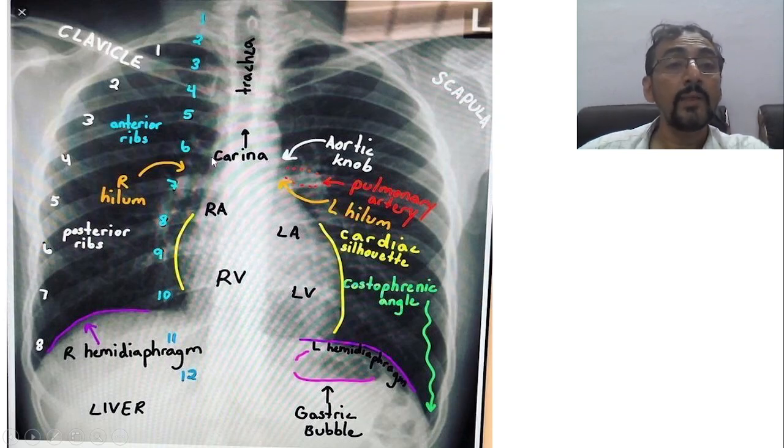दिस इज हाउ वी आर काउंटिंग द रिब्स. ओके, देखो, एक दूसरा रिब है, तीसरा, 4 5 6 7 8 9 10. ओके, सो नाउ दिस इज राइट डायफ्राम. क्लियर. नाउ कम टू दिस एरिया.